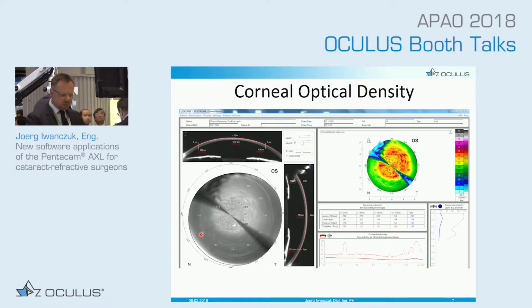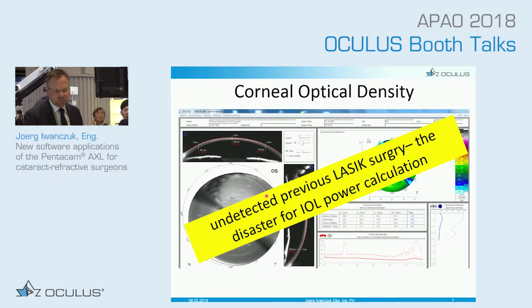When you look to the topography, this is obviously not visible because the ablation was only 3/4 of a diopter and the cornea was very steep and the zone was very big. So when you do IOL-power calculation for that, the risk to overlook it is very high, and then you end up hyperopic. And we know then we have our problem, because hyperopia is not forgiven by the patient.